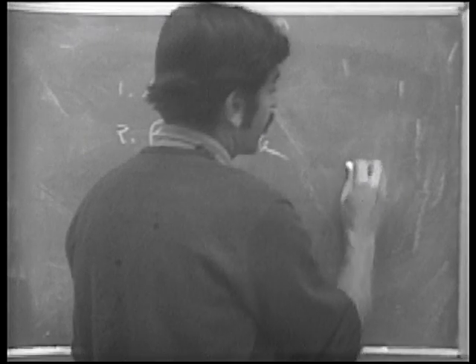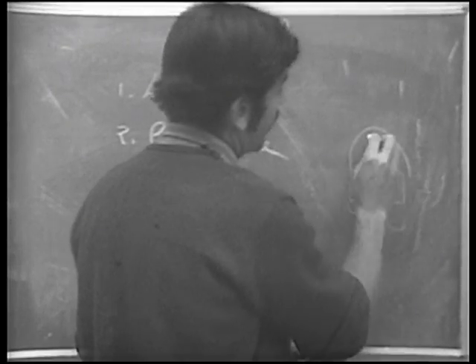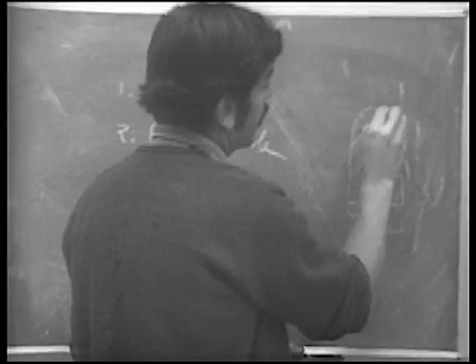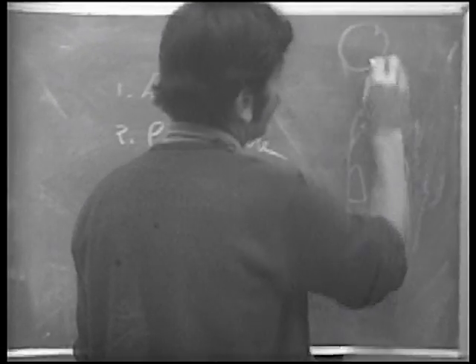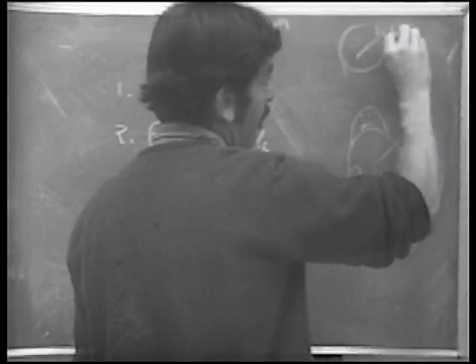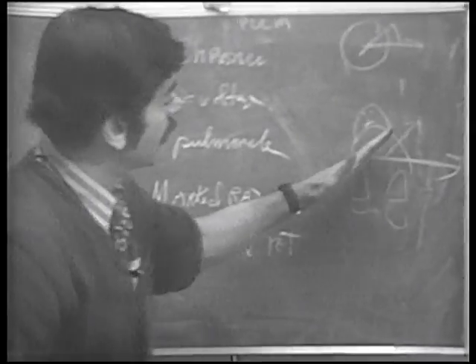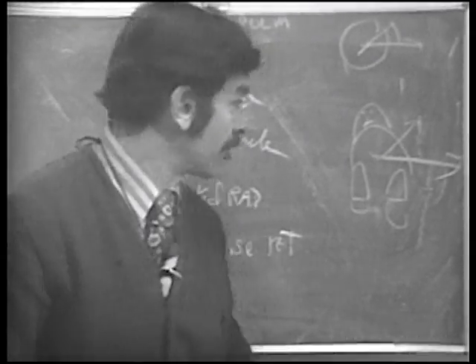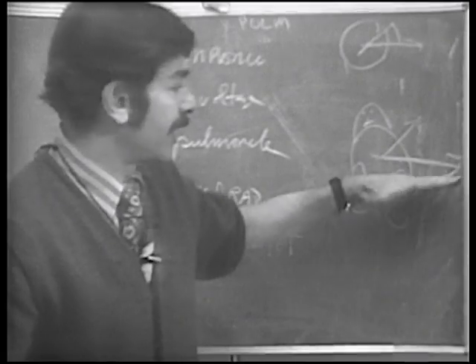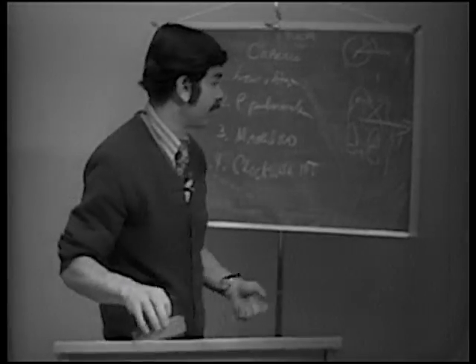But in clockwise rotation, if you recall this diagram here, the patient lying on his back in the bed. Here's your clock. Normally it should be up around here. Clockwise rotation has shifted in this direction here. So instead of your transition zone, your isoelectric lead occurring at V3 to 4, it's shifted out to around V5 or V6. It's shifted around towards the right.